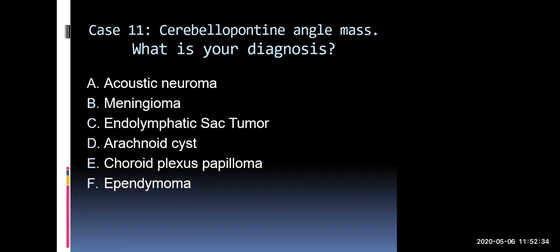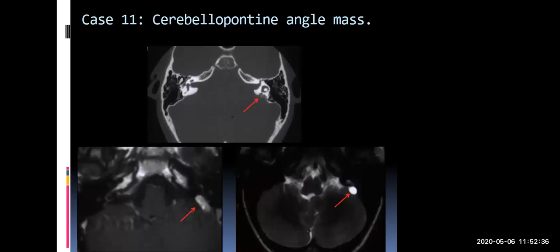So this is clearly a case of an endolymphatic sac tumor. Endolymphatic sac tumors are extremely proteinaceous. They're like papillary type adenocarcinomas, just like papillary thyroids or melanomas. Because of the amount of protein that they generate, they tend to be fairly bright on T1 and T2.